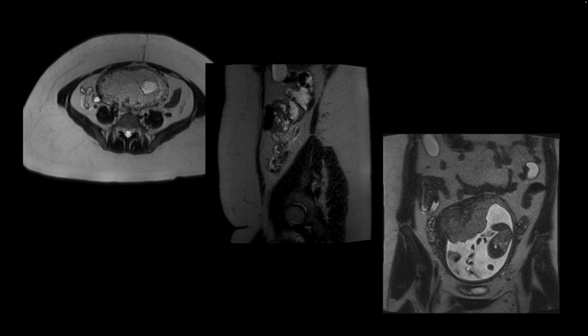This is our next patient. We performed an MRI of the abdomen without contrast. We can see that they are pregnant. This is their gravid uterus, also seen right here. Here is the placenta. And so abdominal pain, especially on the right side, is very common in pregnant patients. It could be because of appendicitis, hydronephrosis, or cholecystitis. And so an MRI is performed to further evaluate these patients.